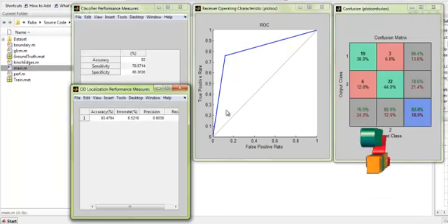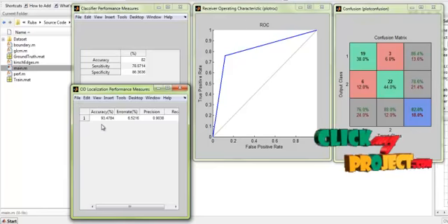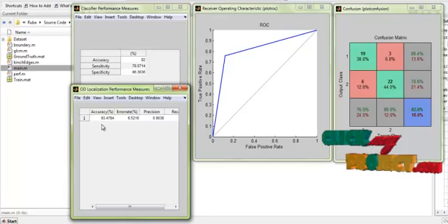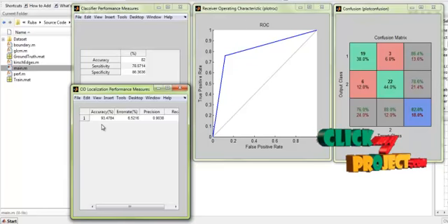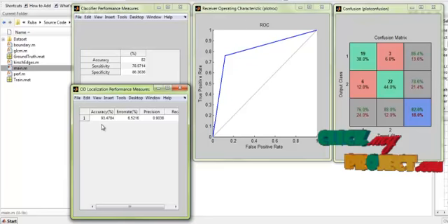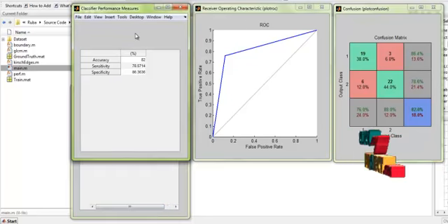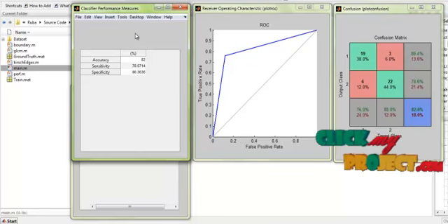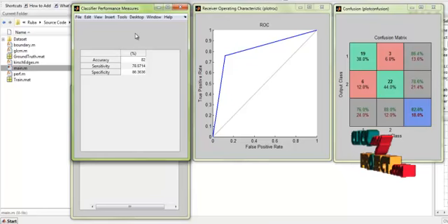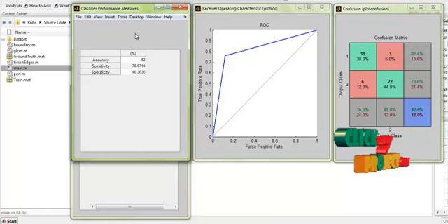So these are the overall performance measures extracted in our process. First, the OD localization performance. This is performed by comparing the segmented optic disc regions with the exact optic disc segmentations, and based on that, accuracy, precision, and recall are extracted for the regions. After that, the classifier performance measures are extracted, where the parameters are estimated based on the SVM classification.